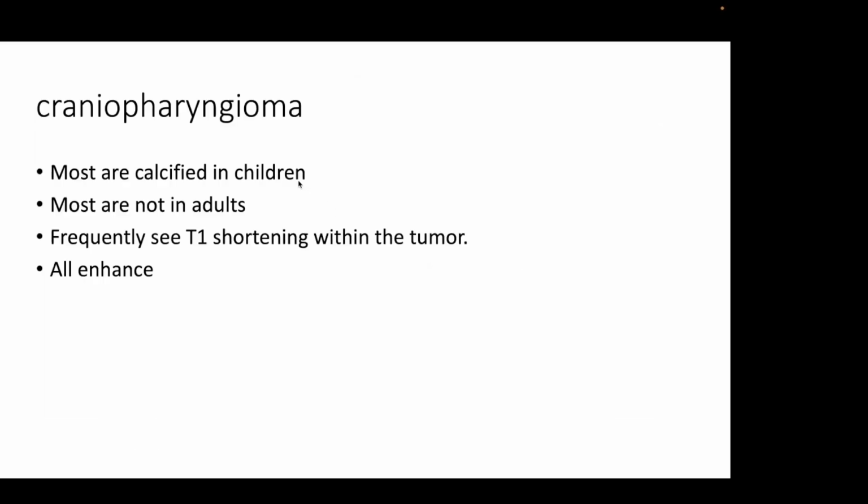These are mostly calcified in children, but remember, they're mostly not calcified in adults. So even though it goes by the same name, they're histologically different in children and adults, and they look different. One thing that can help you is you frequently see small areas of T1 shortening within the tumor on the T1 weighted imaging, and all craniopharyngiomas will have some degree of enhancement. So if it's not enhancing, it's not a craniopharyngioma.